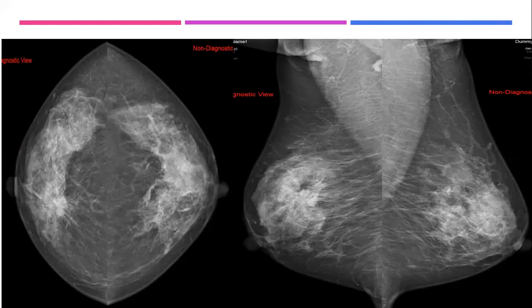Give it BI-RADS 5, for biopsy, and ultrasound for more characterization or for association abnormality. Looking for any other abnormality. Yeah, looking for others.